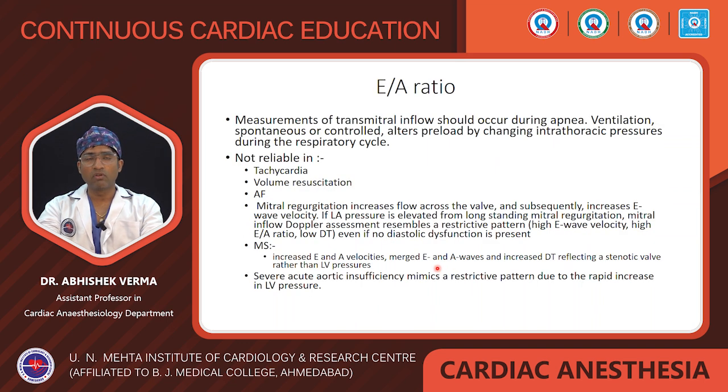We can see this in the algorithm also, and it is measured only during apnea, because ventilation, whether spontaneous or controlled, alters the preload by changing the intrathoracic pressure during the respiratory cycle. Actually, these are load dependent indices. That is why if we change the preload or afterload, or give NTG, the E wave, A wave velocities and the ratio change. That is why we measure in apnea.